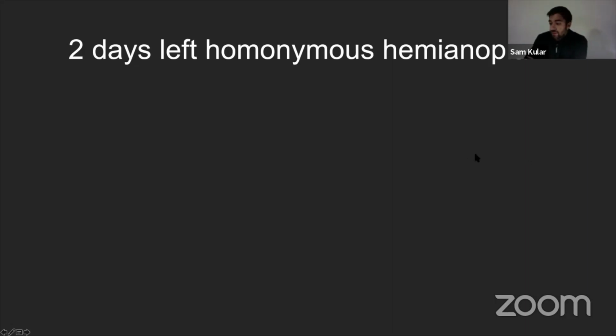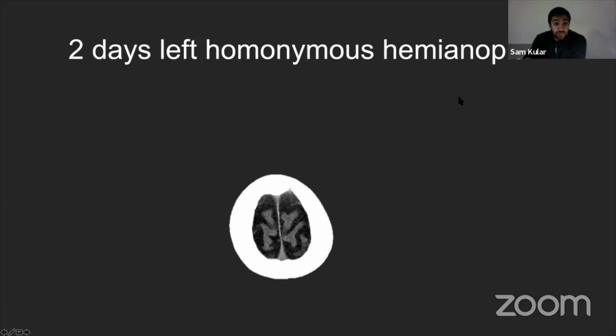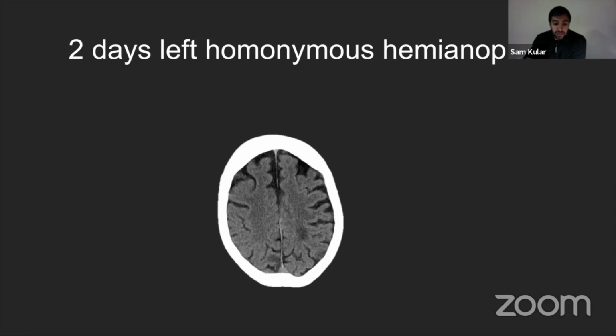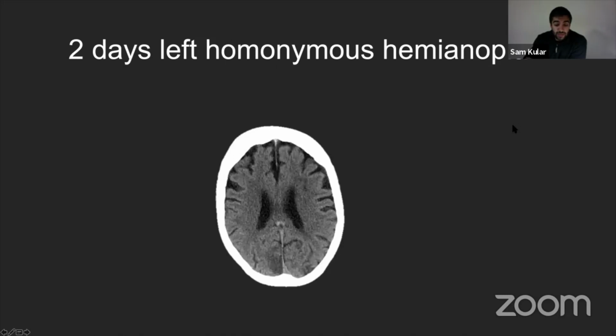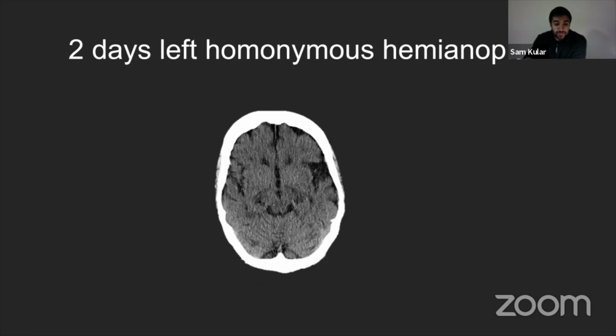Okay, so I'm just going to scroll through a few cases, and if anyone wants to type in what they think on the chat box, then feel free to do so, and I'll see if you can beat me to it. I'll give you a few seconds, and then if not, I'll just present the answers. So this is a case of a patient with 2 days history of a left homonymous hemianopia. So I'm just going to scroll through the CT scan, and if we have any answers, we can just type them in to the box.